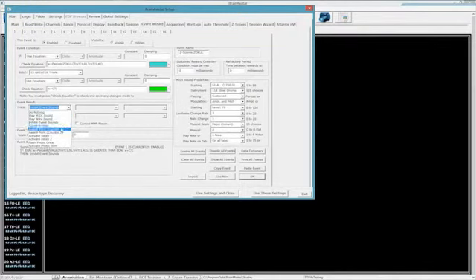And there are other features that can be put in here, of course. You can award a point counter, which is basically another feature of the classic one, which means when this event is successful, I'm going to say you did it 1 time, or 2 times, or 1,000 times. You can also control the second point counter here.